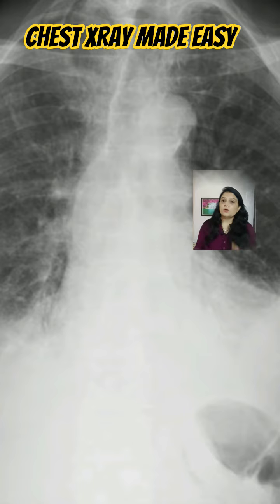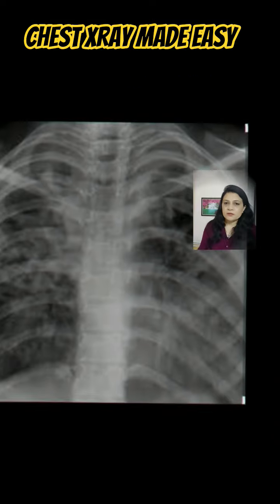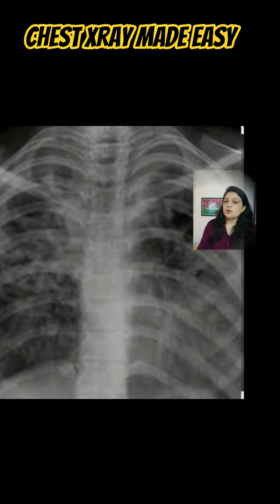So now third on the list is the chest X-ray of the TB patient. So how do you see on the chest X-ray? You will see the small cavities, there are consolidations, and you will see the bronchohilar margins and the lymph node enlargement on the chest X-ray, right?